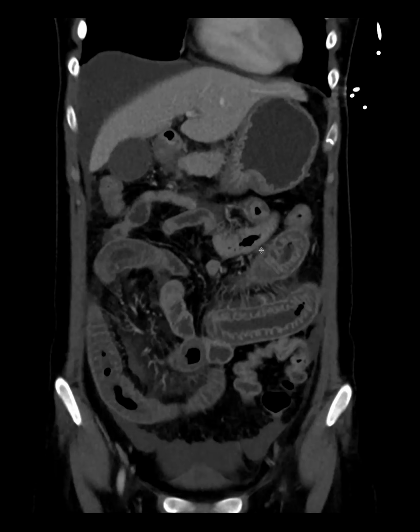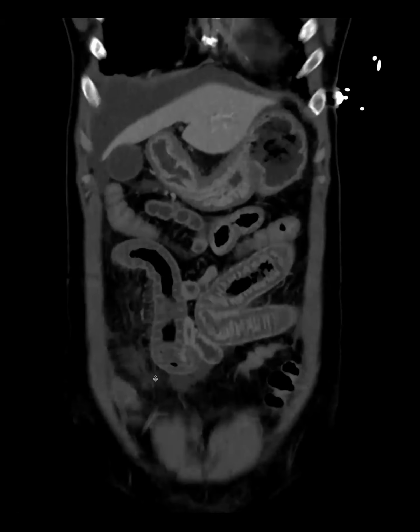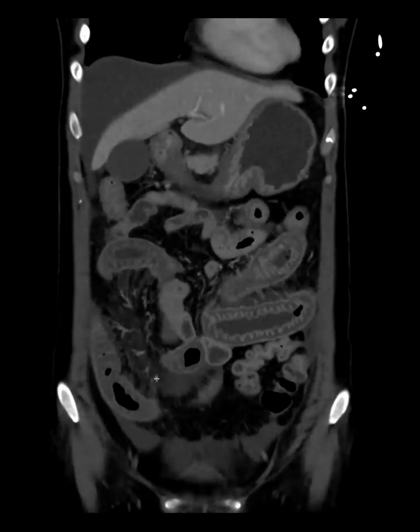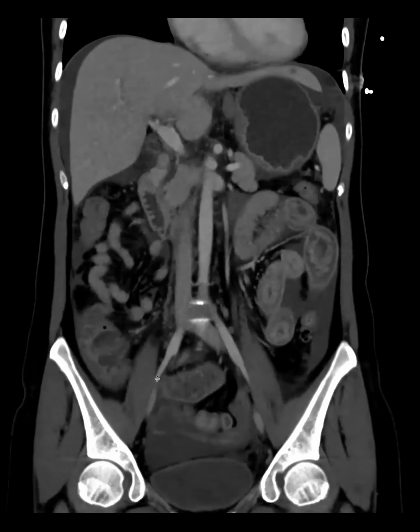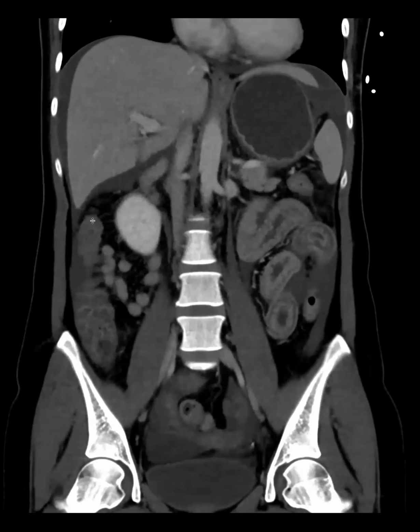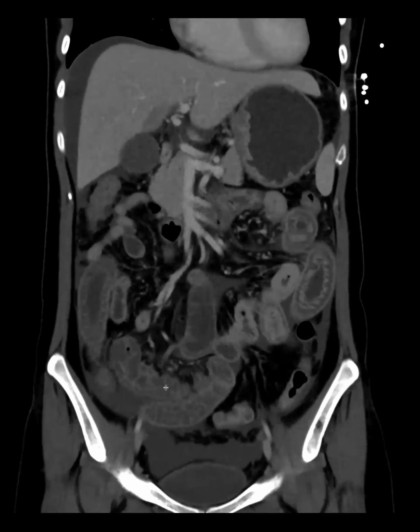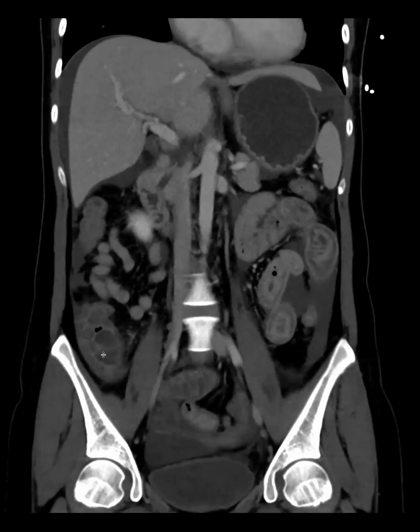I always say stuff. I see small bowel wall edema, and it's pretty extensive. It looks like it's involving the jejunum and also mesenteric edema. So I'm going down my differential of small bowel edema, such as enteritis. Wait, show me the terminal ileum. Oh yeah, and it's also involving the ascending colon. Oh, I guess that loop was the ileum. So it's involving a lot of the ileum.